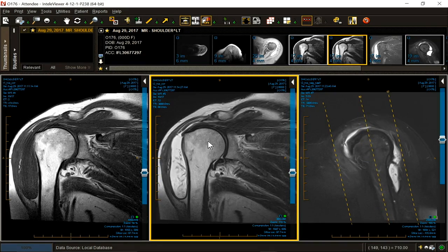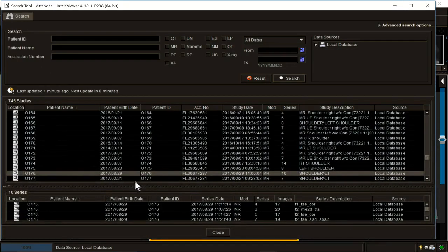So what's our differential? What might we consider? A bursitis, a bursosynovitis, CPPD, synovial metaplasia arising in a bursa, and unlikely something like amyloid, which can present with a shoulder pad sign and a massively distended set of subdeltoid bursa. So let's go to the next case, 177.